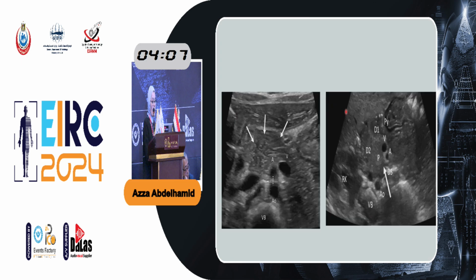Okay, what's the difference? Which one is normal and which one is abnormal? In that case, this is a case of normal orientation of the vessels. You always see the vein at the right side of the artery. These are mesenteric. And most importantly, the distance between the mesenteric artery and the aorta is filled here with the structures. That's the uncinate process of the pancreas, and this is the third part of the duodenum.